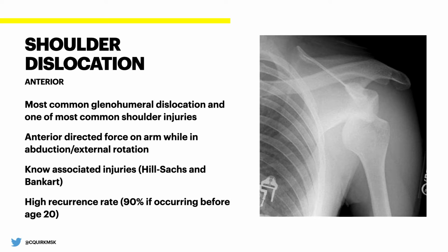A little bit more about shoulder dislocation. So the anterior dislocation is going to be the most common by far. 95% of cases are anterior. These patients come in with this radiograph where the humeral head looks kind of anterior and inferiorly dislocated. The best way to tell that from luxatio erecta is obviously that they're not abducted in this position.